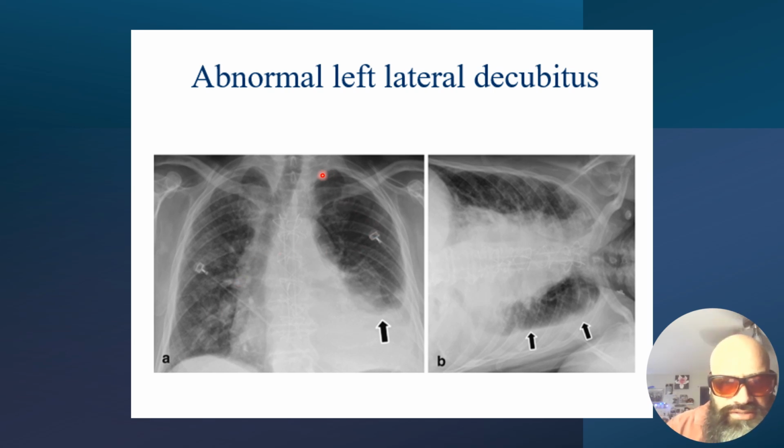So here we can see that this PA view here, you can see that there is a significant mediastinal shift. The trachea is deviated towards the right. We have complete obliteration of the cardiac borders, both on the right and left. They are coalescing into that left hemidiaphragm. Airspace is being taken up by fluid density here, as we can see. So sometimes we have to determine if it's fluid or if it's pus or some sort of viscous fluid that is causing issues.